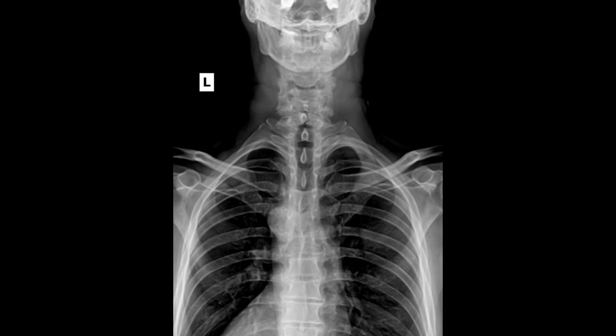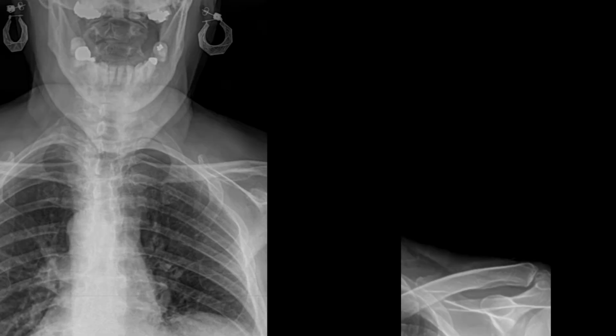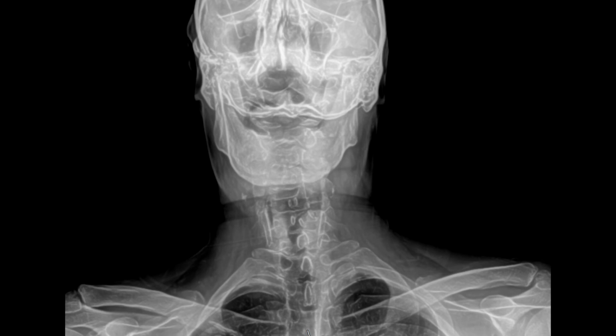In this view, even though the cervicothoracic region looks okay, the upper cervical spine is completely obscured by the mandible and overlapping occiput. And what I tend to find is you can either see the upper cervical spine well or the lower cervical spine, but you can almost never see both well. And here the mid to lower cervical spine is really obscured, and then technical factors completely limit assessment of the thoracic spine. This patient actually has numerous osseous congenital anomalies. Not that you would ever know it given this image.